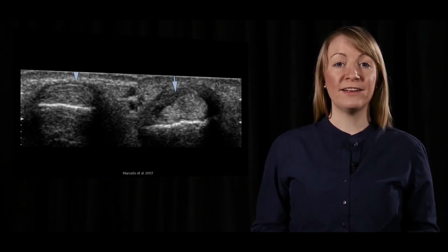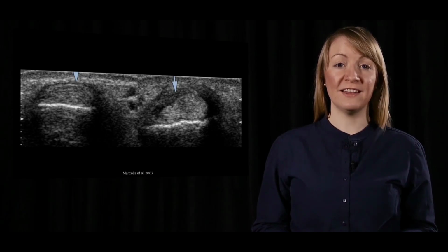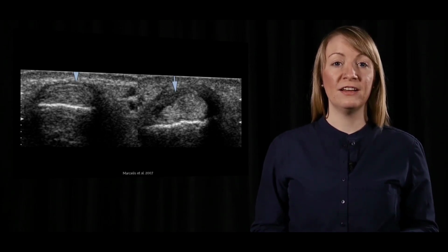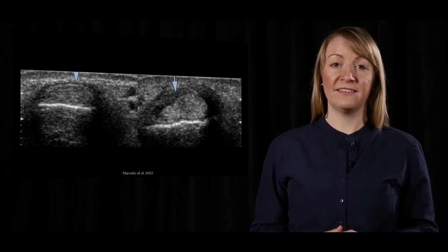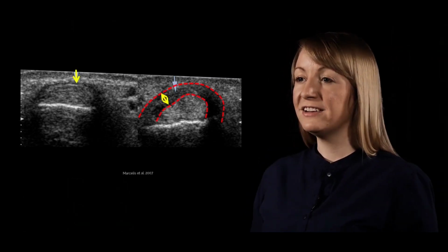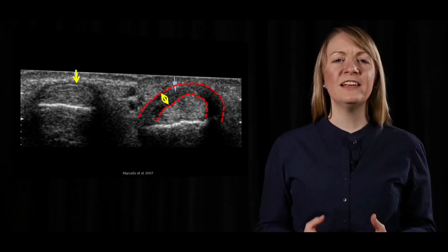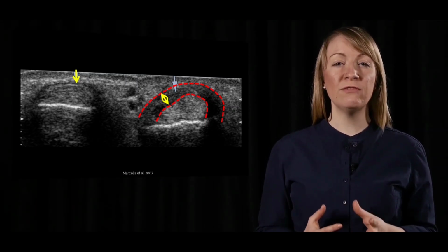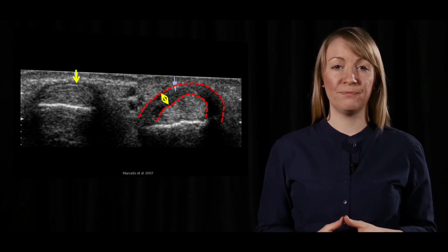This is a left-right comparison of a transverse extensor tendon. The image on the left shows the healthy side, the image on the right the affected side. The shape of the retinaculum on the right has changed. See the increase in thickness compared to the healthy and very thin retinaculum on the left.